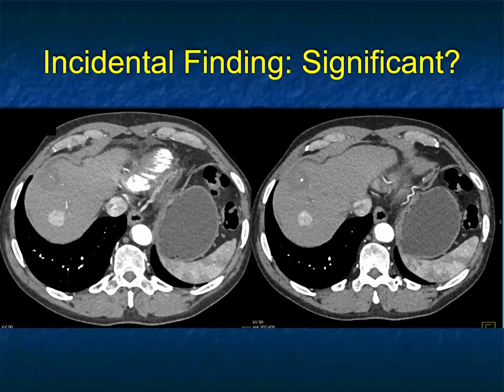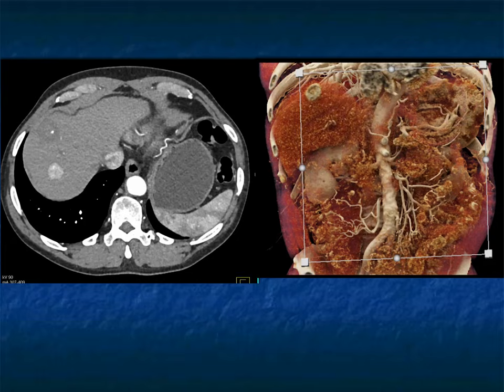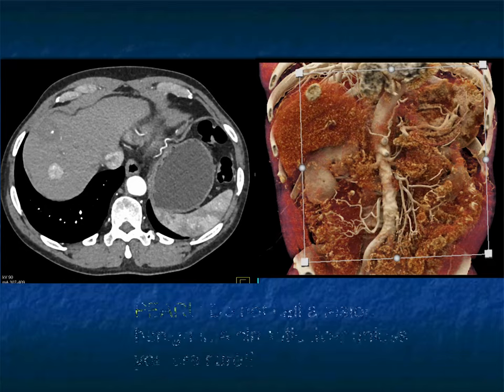But remember, in the last case, the hemangioma had peripheral enhancement and central filling in. You can get very tiny hemangiomas that fill in with flash filling, but those are uncommon. And when I see a cirrhotic liver like this, and I see that second lesion, I'm surely going to worry, even with just the one lesion, that I'm dealing with a hepatoma.